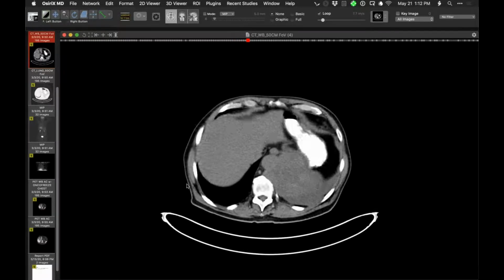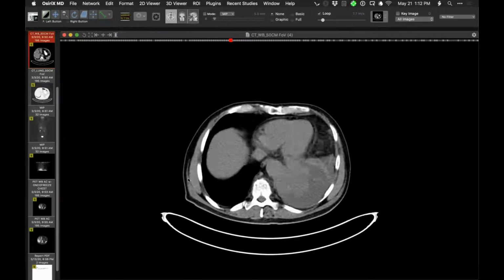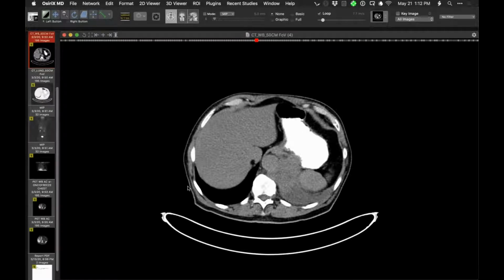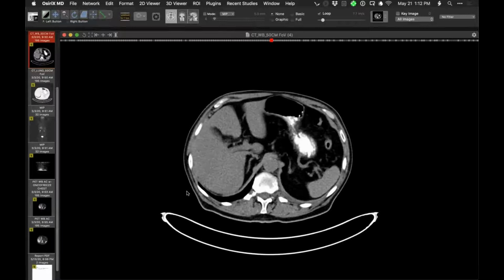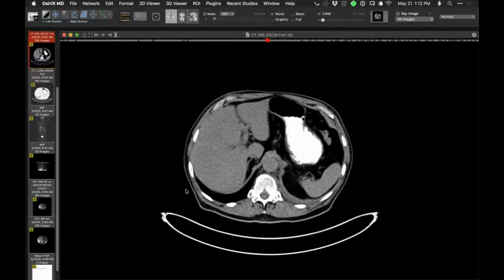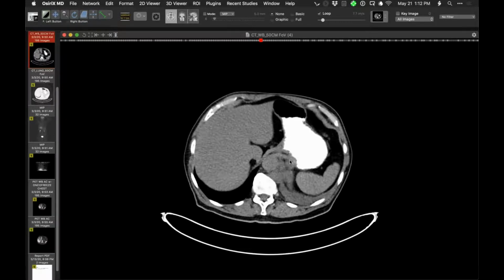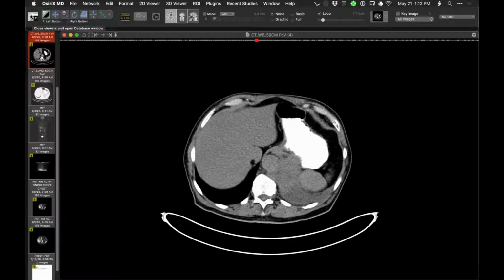It's true. Yeah, because there's only a little. I would expect if it started in the mediastinum, it would have pushed the aorta over more, unless it gained entry into the pleural space early on and was able to just follow the path of least resistance. But yeah, it doesn't really matter too much. I was trying to decide whether some of this is an elevated diaphragm or crus up here somewhere, but it is hard. All right.